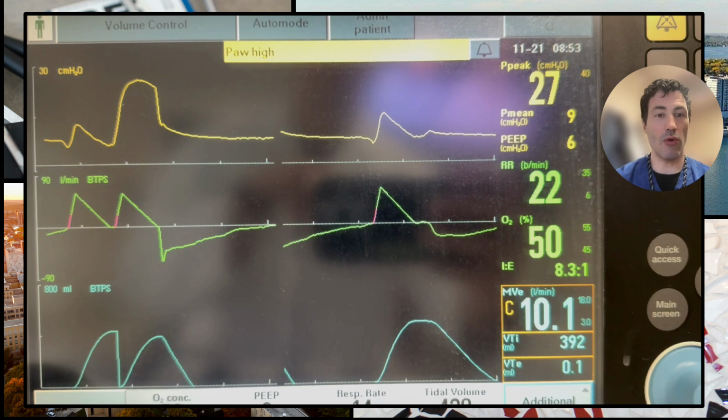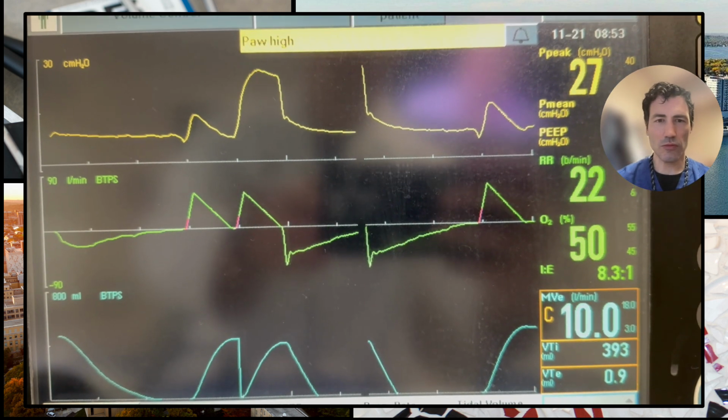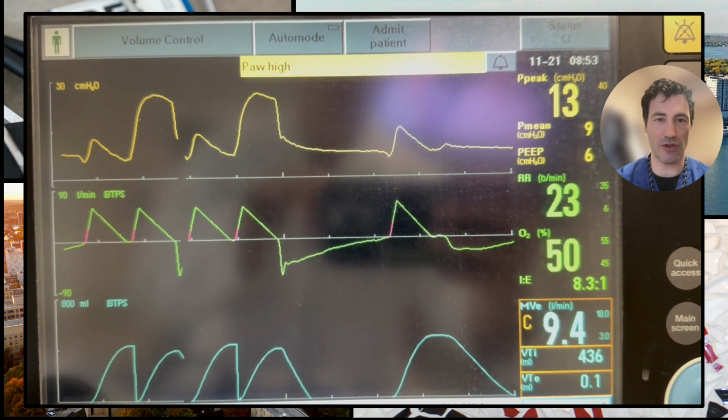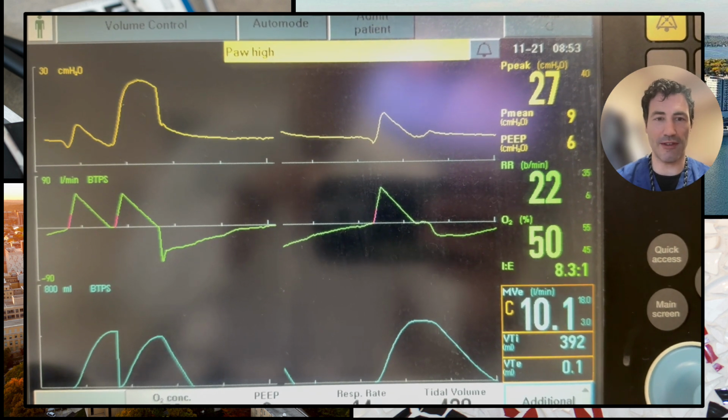So here we have a textbook flow waveform, and normally the pressure should either have that nice peak and plateau, or just like an alveolus balloon gets bigger, the pressure should go up over time. But I see that I have all these different weird pressure waveforms, so it does not look like a textbook. And here it is again. When I say what's not a textbook, we have a peak, moving down towards a plateau, but I have this big second pressure hit. And I also noticed that my not textbook appearance is that we breathe in twice before we breathe out at all.